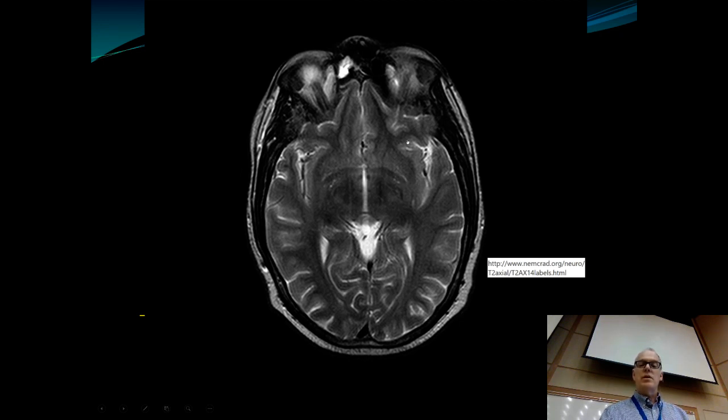All right, so this is the Sylvian fissure out here. So remember, CSF looks bright on an MRI, so this is also bright. So we're looking at the space here in the Sylvian fissure. This is all Sylvian fissure. So the little dark areas here is the middle cerebral artery, because remember that is out in the Sylvian fissure.